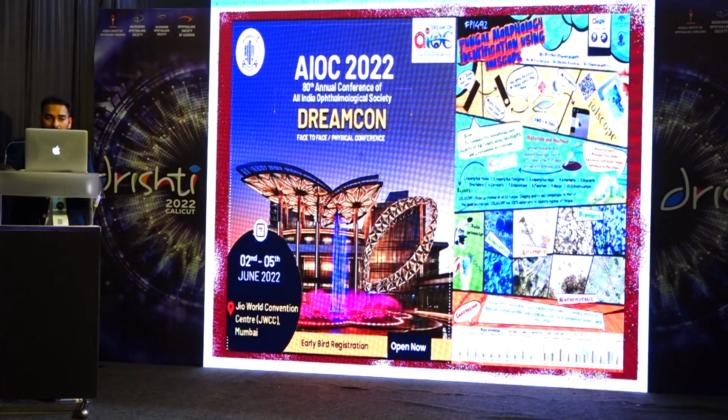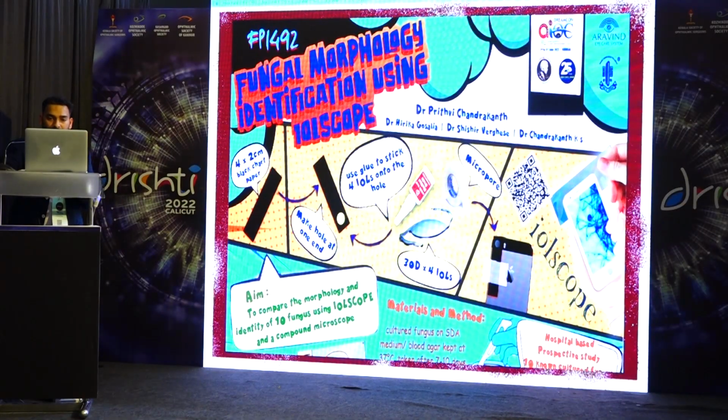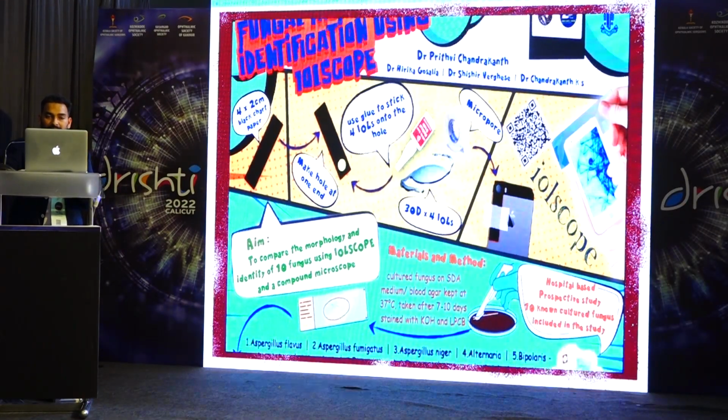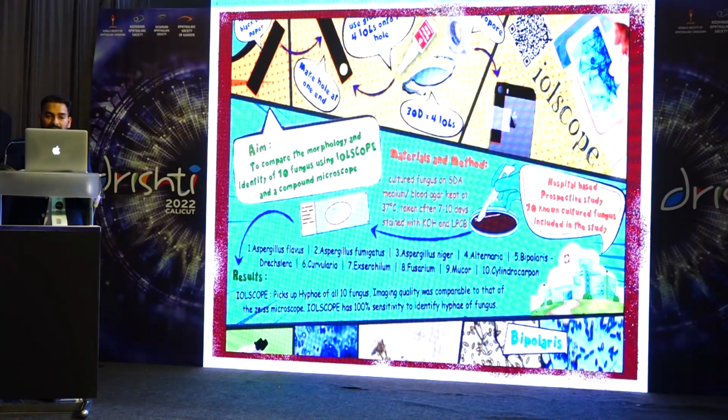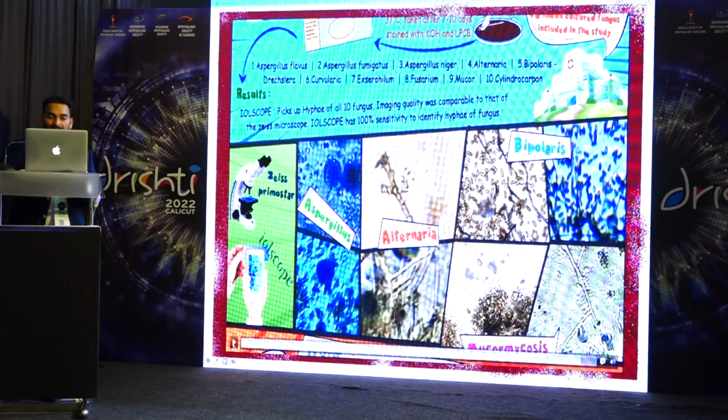Recently at the All India DreamCon in Mumbai, we presented a physical poster which won an award. This is the first study, called the first Fungal Hyphae Detection Study, where 10 such fungi were diagnosed for their morphology and the clarity of hyphae. As you can see over here, Aspergillus. This is an actual microscope, and this is the IOLSCOPE.